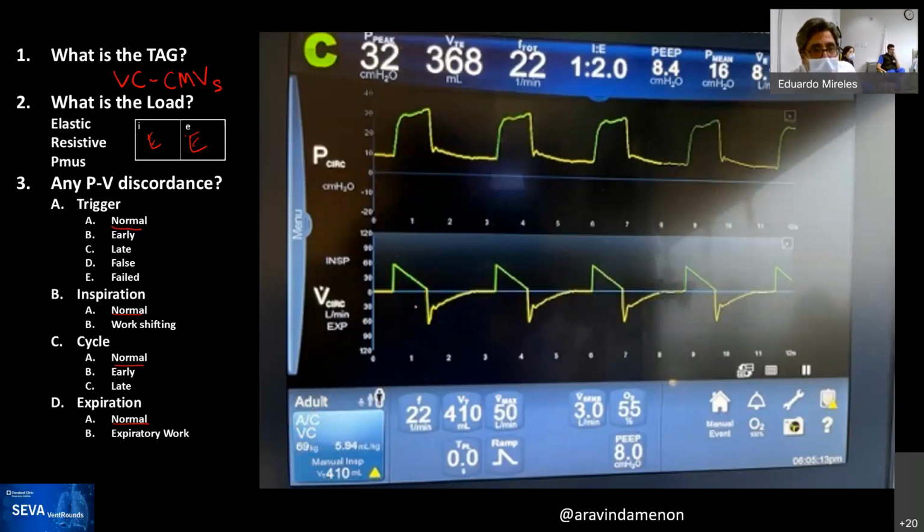You can see it says 410. You are absolutely correct. Just by the fact that every single breath the flow is controlled, it becomes mandatory, because you're controlling the start and the ending of the breath. And in this ventilator, there's no other intelligence in the mode or in the targeting, which makes it a set point by itself. So absolutely correct.